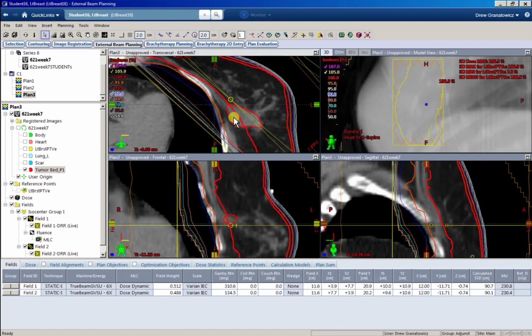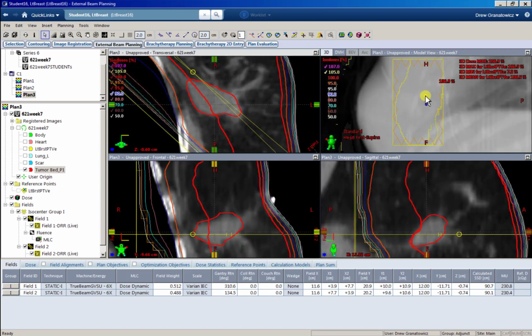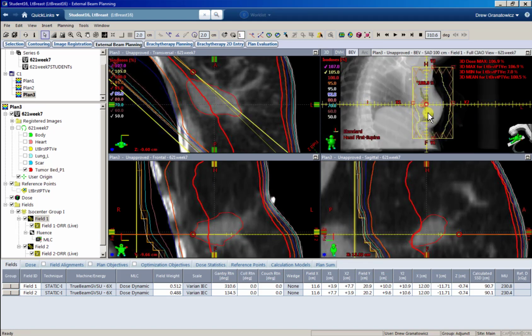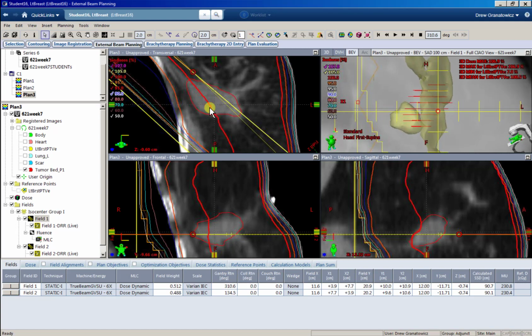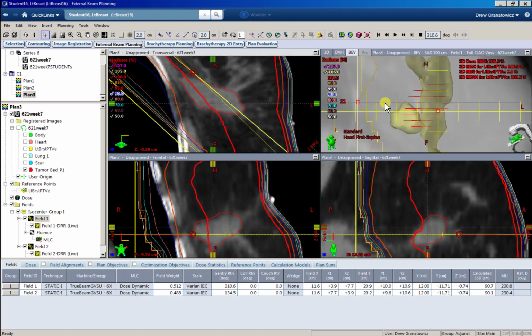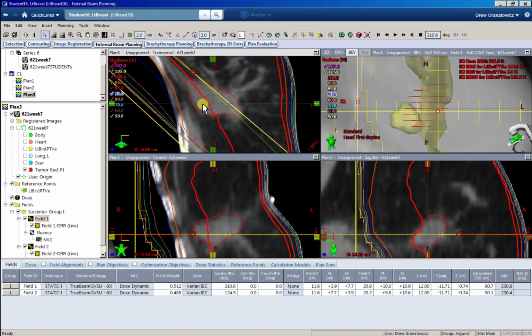So the easiest way to do this, I think, you can just zoom in here and you can see as we scroll on our axial slice, we can see what slice we're on in our 3D view, right? So anywhere that's cold, you can just stop and paint that specific area.